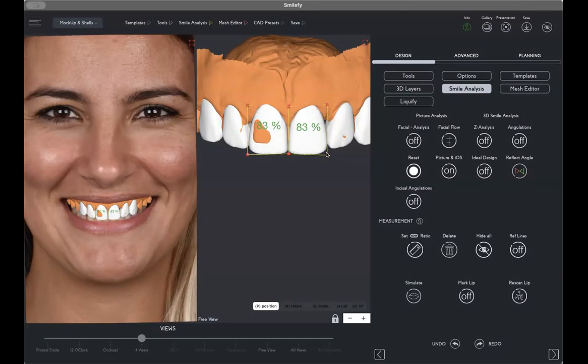If we want, for example, to go with the ideal ratio, right? The ideal ratio would be 100 to 80. And I say, you know what, we're going to redesign and make it work for 80. Good. So I set the box to 80. Now I have a visual reference for my tooth, and I change the size to 80. You see? Now this central is 80. It's a tool to make it work, and to check if the ratio is fine. Good.